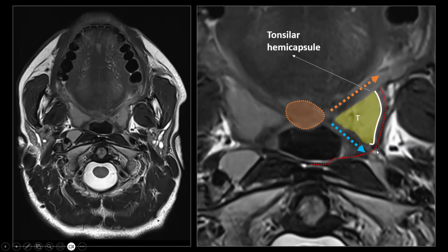Now, this is a structure we can't see, but the palatine tonsils actually have some kind of capsular lining, a hemicapsule lining the lateral wall. And between the muscular layer, so the superior constrictor muscle or middle constrictor muscle, whatever, which is surrounded by fascia, by the way, and the tonsillar hemicapsule, we have a space called the peritonsillar space.